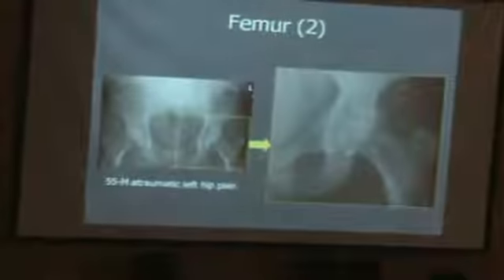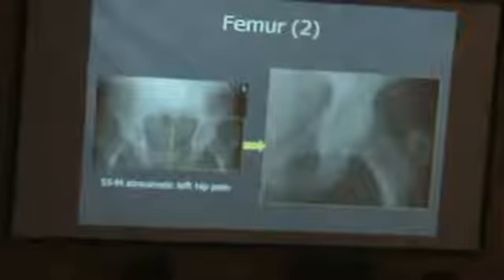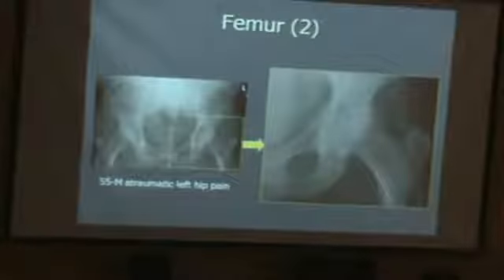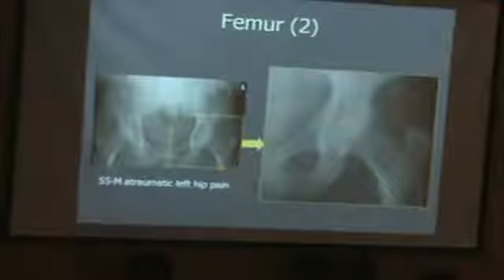Now this is a 55-year-old male with atraumatic left hip pain. Do you see anything? I don't myself. So you have the spot image here. You look at the neck, you look at the head, there is nothing.